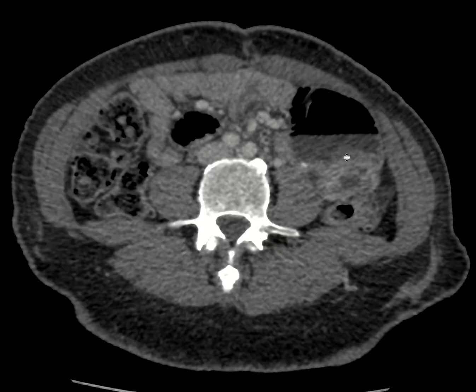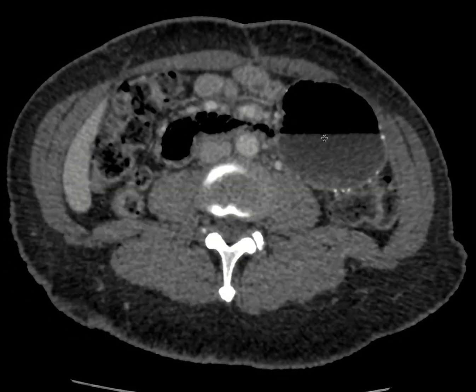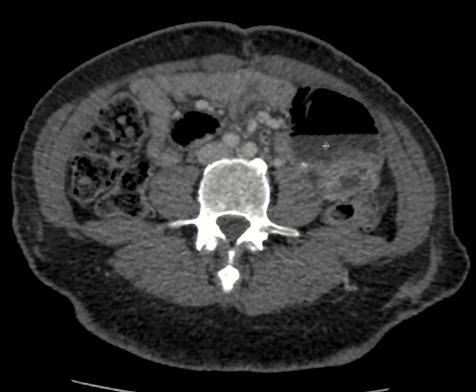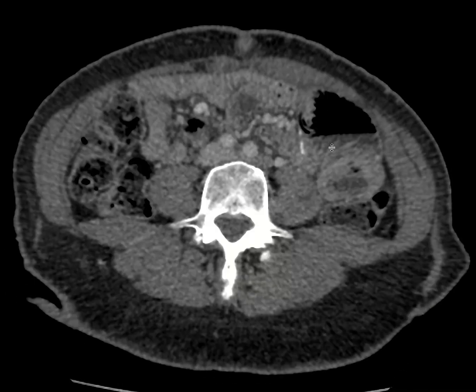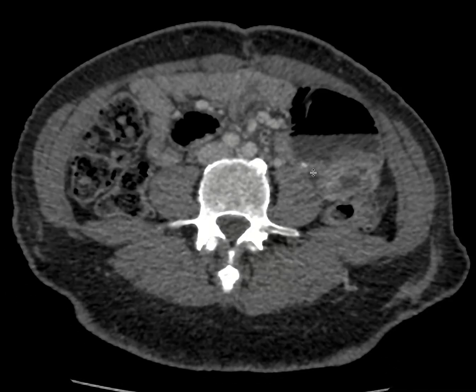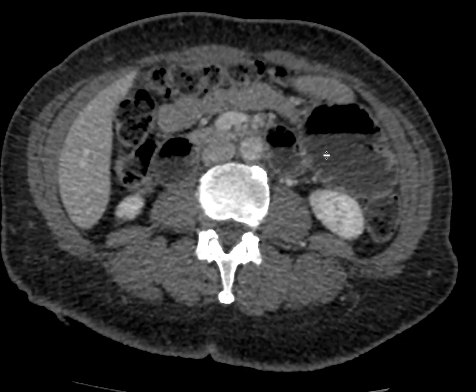The thing that I wanted to point out, though, is that there is dilation here of the more proximal portions of the jejunum in the efferent limb. And one of the things that we think about, especially when they've got these staple lines here, is that they can have denervation. And so this kind of floppiness can be seen.